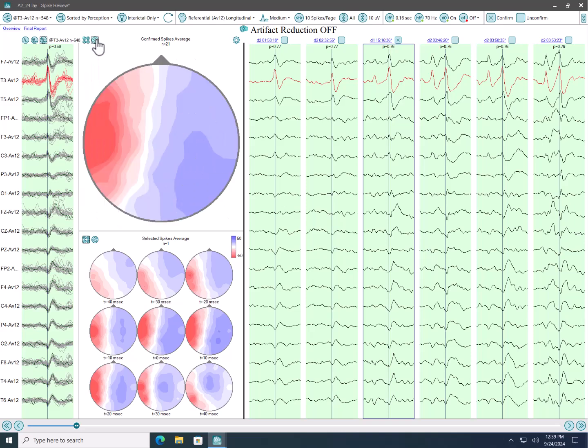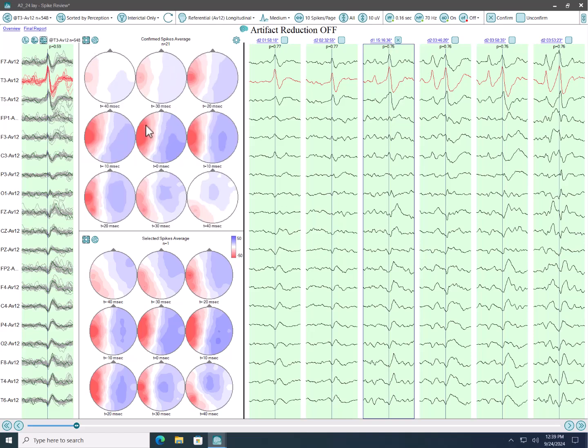We looked at a single map, and this shows that we have maximum negative amplitude here in the left temporal. And if we go to a propagation map, we can see if it's starting in one place and ending up at peak voltage at another, basically speaking. So there's more to it than that, but that's a propagation map, and that's the first type of mapping that we can do. Now, if we want to do some other voltage mapping, we'll look at the ability to do that using the Insight 2 program. That's where another whole collection of tools is available.